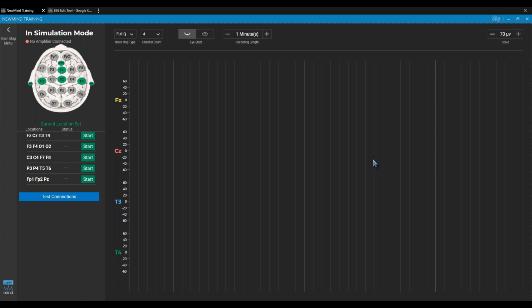So if during that minute of testing I saw half of the time I was getting a clean signal and the other half it was artifact, I'm probably going to do maybe 3 minutes and keep my fingers crossed that that's enough and that I don't have to remap this kid in a week.